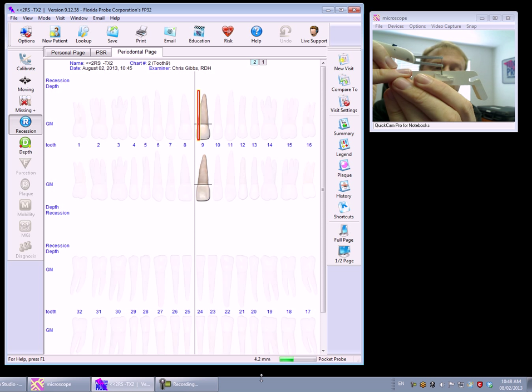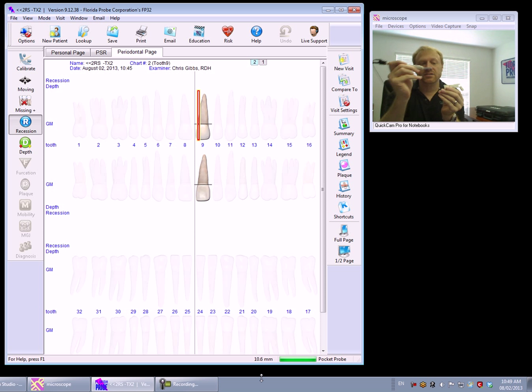You move it over to the next step. Obviously, it's hitting the one marked 6 millimeters. And if you notice at the bottom of the screen, it now says 6.0. I bring it over to the third step, and of course you can measure a 9.0 as well. So that just allows you to show that you are actually measuring 3, 6, and 9 millimeter marks on a calibrated tool here on the back of your tip protector.